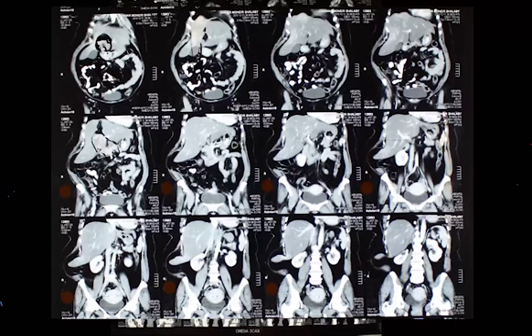And we saw an aneurysm that developed another complication. What other complication can develop? There was a thrombosed aneurysm, exactly. We saw another type of vascular pathology in the artery. What did we see in the artery as well? What else can happen to the artery? It presents with chest pain or abdominal pain referred to the back. Dissection. We saw dissection.